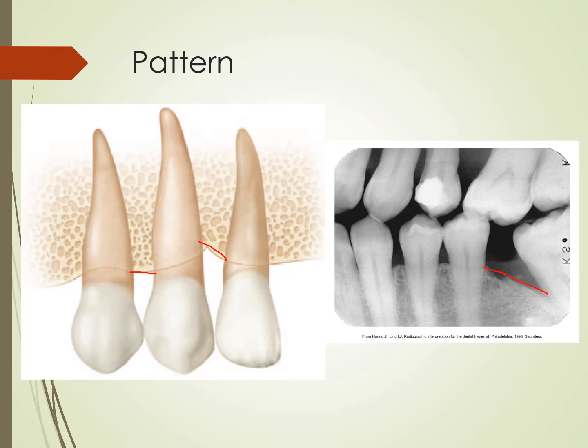When you start seeing patients, you're going to have to go through your radiographs and say, this is horizontal bone loss, this is horizontal bone loss, this is vertical bone loss. This up here, I have no idea, because this bite wing does not show us that crestal bone.